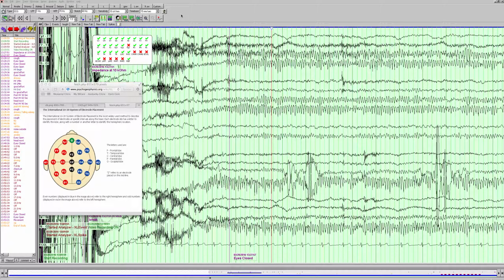On this first video today, we are going to look at a normal EEG together and learn about the features of normal EEG. As you watch these videos, you'll see that I do tend to repeat myself a lot, and I feel that that's helpful to just hear the concepts over and over, then they stick in your head as you're learning. One thing I want to point out from the outset is that EEG is not easy.